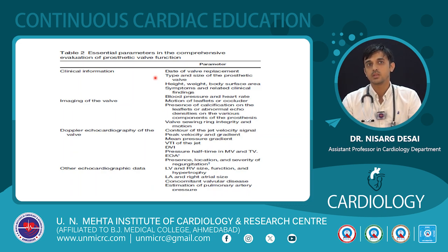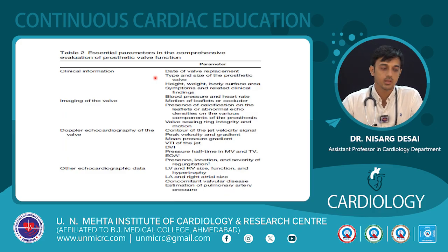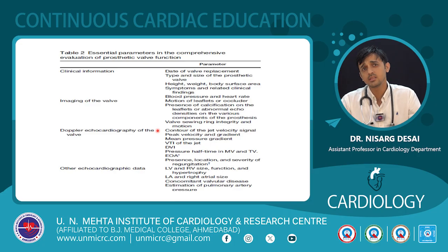So once we have screened and we have found some abnormality or not, it is always better to look for the gradients across the valve. So if there are high gradients across the prosthetic valves, then the Doppler assessment can typically be studied under the following headings: what is the contour of the jet velocity, whether it is a triangular one or a tongue shaped one, what is the peak velocity and the gradient across the valve, what is the DVI or Doppler velocity index, also known as dimensionless velocity index. So we'll study what this is.